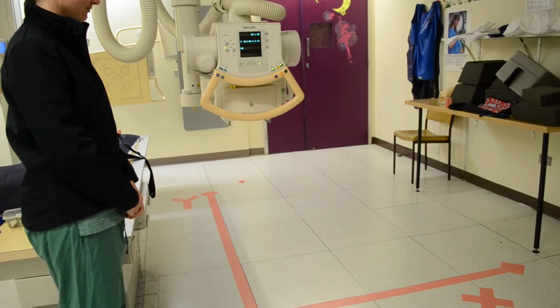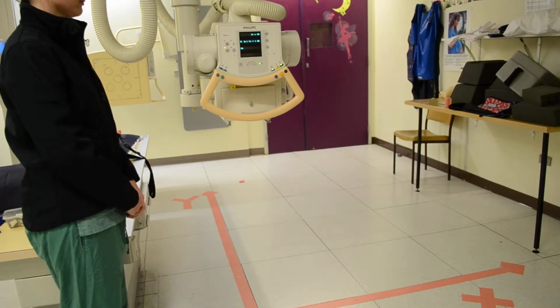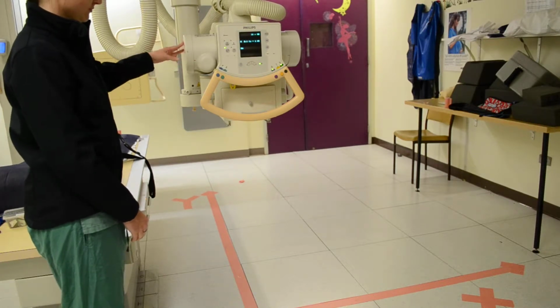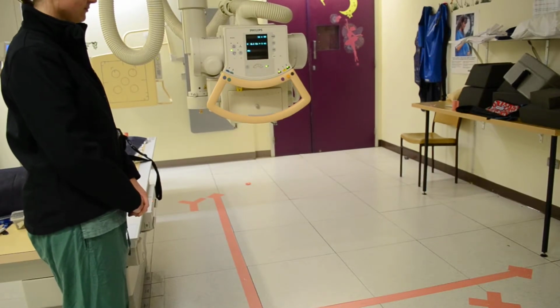Okay, here we have a ceiling suspended X-ray tube. The X-ray tube is in the X-ray housing, which is basically a cylinder. So if you're going to draw this, in 2D or in 3D, it's simply drawing a cylinder.